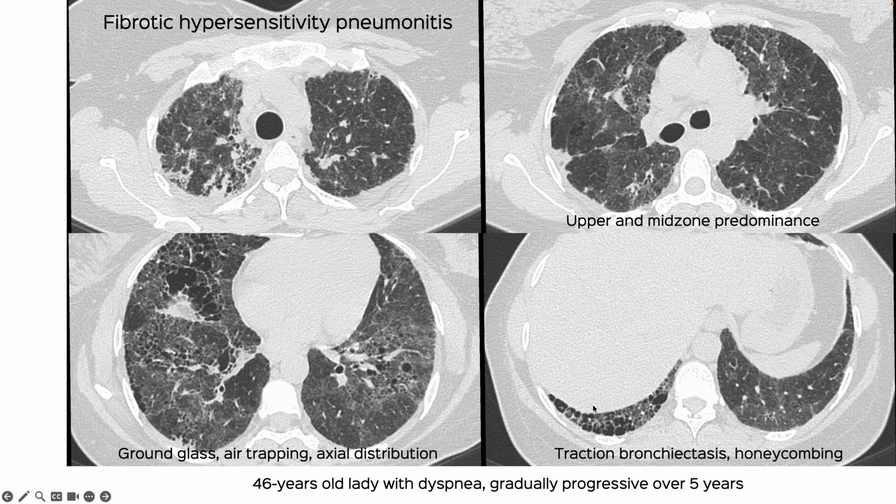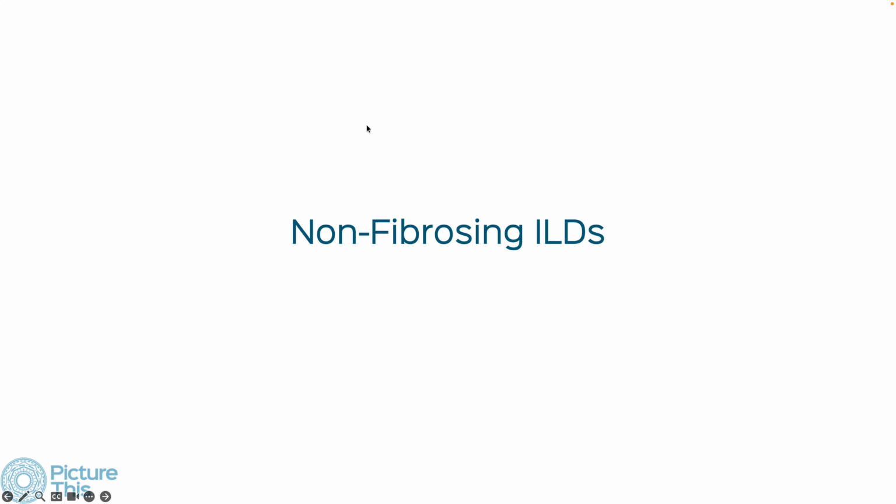As in this patient who has honeycombing but has an axial distribution of disease from hilum to periphery with traction bronchiectasis but with ground glass, ill-defined centrilobular nodules, and in many parts of our city and country this is characteristic of fibrotic hypersensitivity pneumonitis. The pattern is non-UIP, bronchiolocentric interstitial pneumonia, or a BIP pattern, and that is the entity, the etiology that causes it.